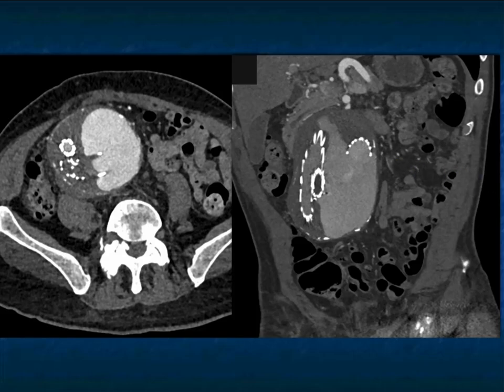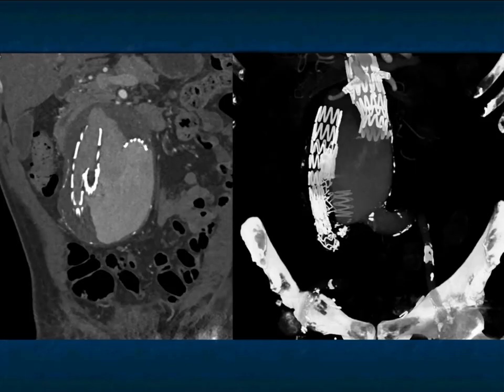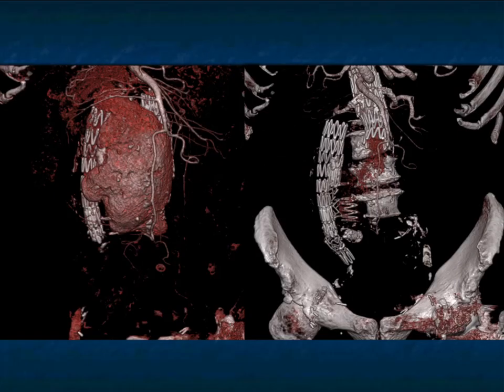Remember, they're always next to each other, those stents, and then you realize what happened here is the stent basically failed and dislodged, and kind of large active bleed. This patient actually survived. They were very lucky because the bleeding was contained within the aneurysm sac. But look at the failure of the patient's endovascular stent. Just very, very impressive. And here it is on the 3D volume rendering.